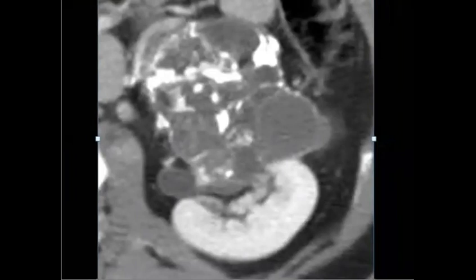Yeah, cystic renal cell, perfect. And they mentioned that if you find any calcification inside a lesion in the kidney, you should mention RCC until proved otherwise. Yes. So this will be the differential diagnosis.